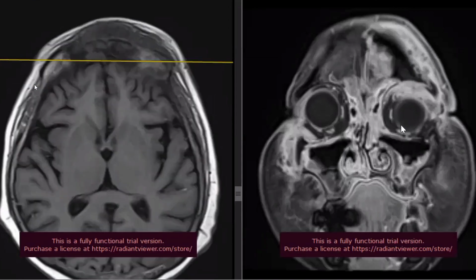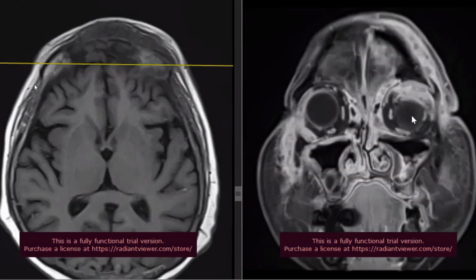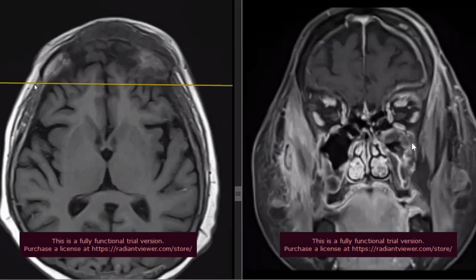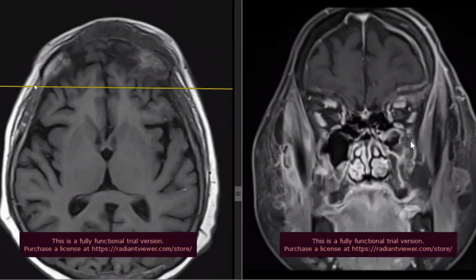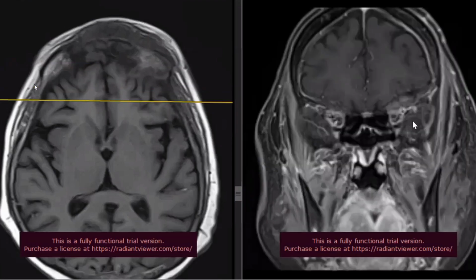So what do you think, is there intracranial extension or not? On this coronal section, I can see that there is enhancement of the dural lining as well. The dural lining is enhanced, so there may be associated meningeal infection. Yes, that is correct: when you see such an abnormality, the surgeons will ask whether there is an intracranial brain parenchymal abscess or not.